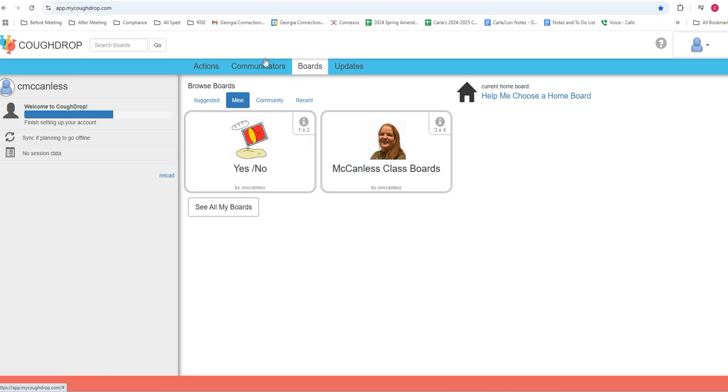But that is a quick rundown of just the basics and what it looks like. And then I will make a quick video on how to create a board, a simple board.